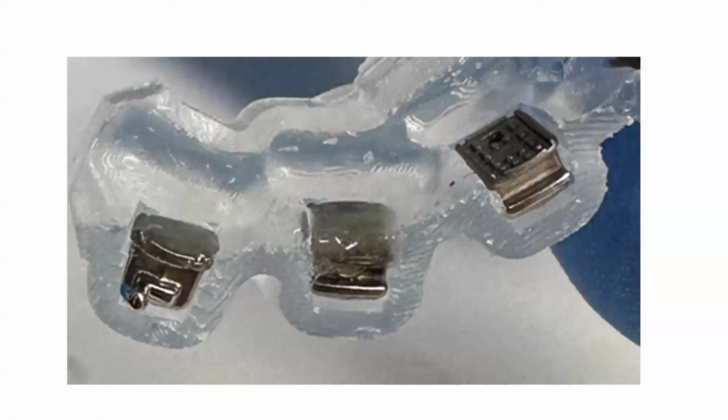Okay, excellent. In your bonding procedure, do you push on the facial of the tray, and does that create excess flash? If you have a glob of adhesive there, and you push on the facial side, does it spread out that adhesive and create flash? Good question. It's very similar to Invisalign attachments, I feel. A seasoned, well-trained assistant knows how to fill a transfer tray just right so you're not going to have a ton of flash, but also not be stingy and have any voids anywhere. It just takes a little bit of practice.